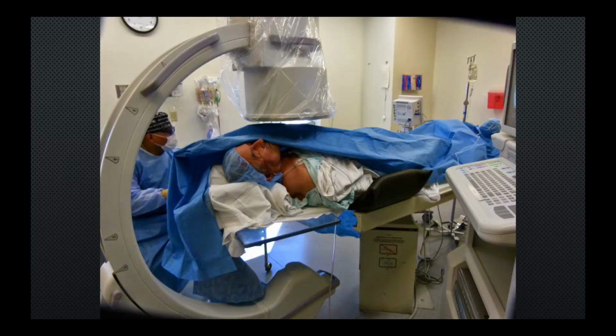Venothromboembolism remains a great masquerader for common complaints such as skin infections, poor circulation, dependent edema, and musculoskeletal injury. Prior to the utilization and improvement of ultrasound, diagnosis would require venography, where the femoral veins would have to be directly injected with kidney-toxic contrast in hopes of catching an area of flow deficit.